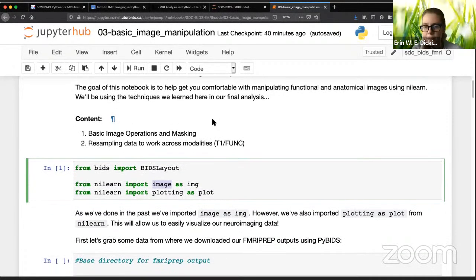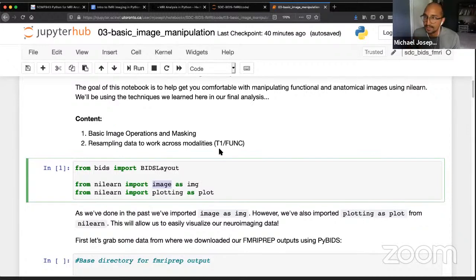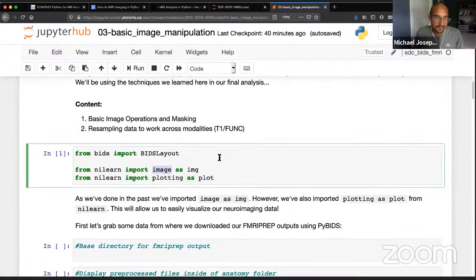I think Paul's asking because we say we're removing 4, but with the indexing, it looks like we're actually removing 3. Oh, okay. 3 or 4 is usually kind of up to us. There's something actually, I think, in MRIQC that gives us an idea of that. Actually, also potentially in fMRIPrep. But yeah, there's no 3 or 4 standard. But that's a good catch. I think we'll update that as we get to that notebook. Thanks, Paul.